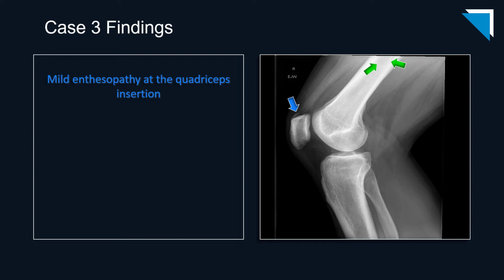This case is the stuff of nightmares for all of us. Look all the way at the superior margin of the image here. Can you see it? There is a subtle lucency in the mid to distal femoral diaphysis. My goodness, I think 9 out of 10 radiologists would miss this with the history of trauma.